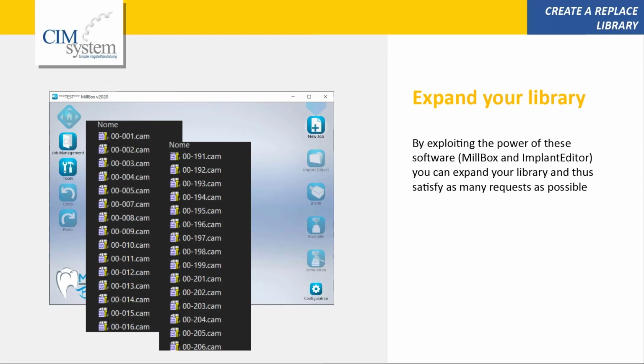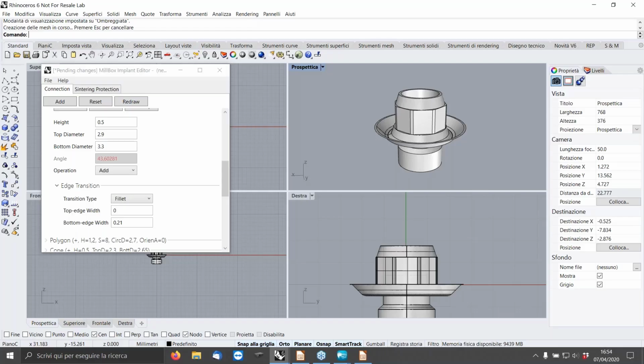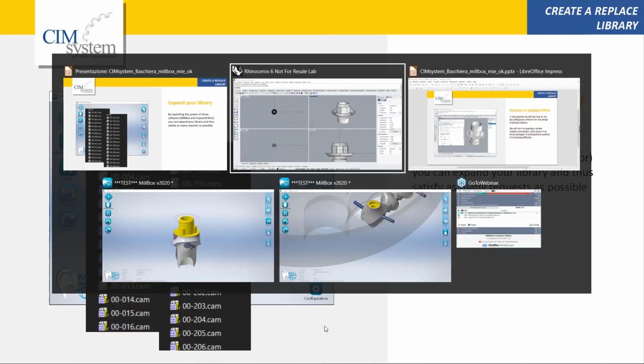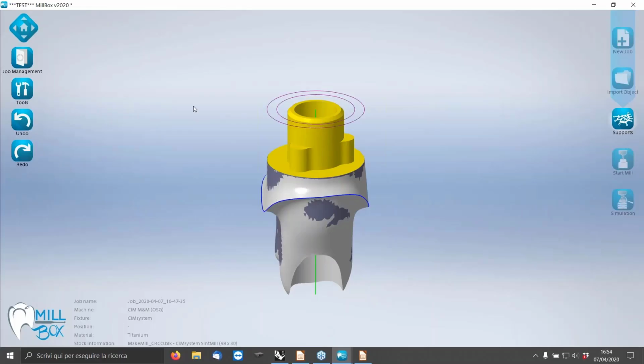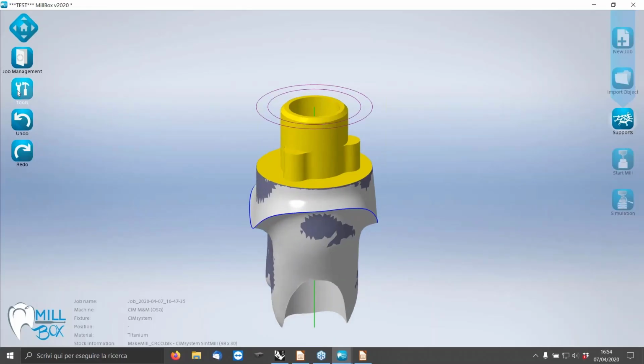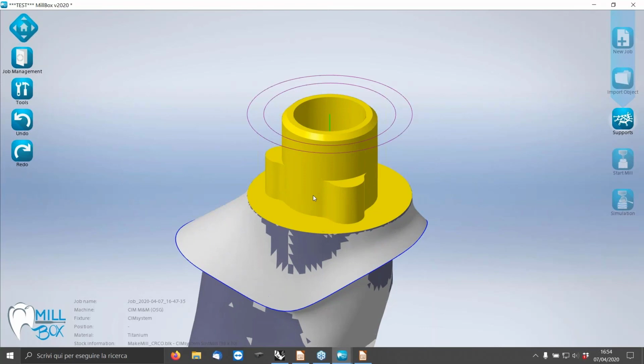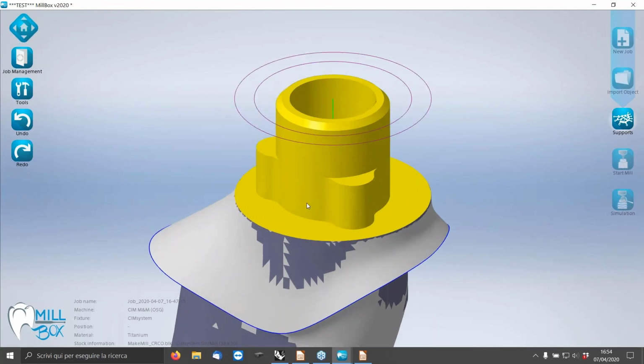Okay, yeah, sure. When you go to laser melting, let's go back to this one. When you go to laser melting, obviously it's not possible to produce this part, the connection part, with accurate milling.